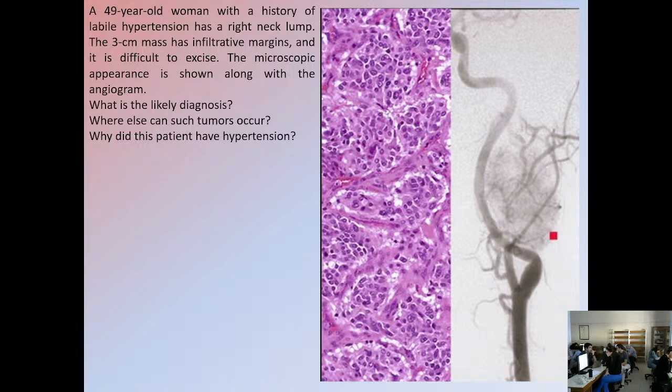If you have a uniform appearance of neoplastic cells, it favors a benign lesion. There are exceptions in this rule. However, that's the rule. So have a look at these cells.